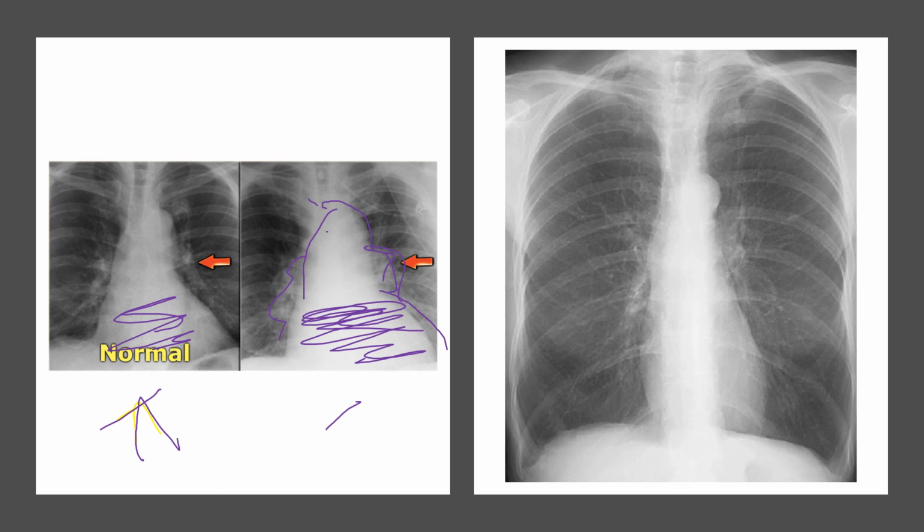And then over here is a case of hyperinflation. This would be emphysema. And one of the classic signs of an emphysema x-ray, and I will ask you this in disease class, so get ready, is going to be that tall, narrow, column-type heart. Because you see how tall and narrow that is? It's because the lungs are squishing it. They're being pushed in with all this hyperinflation. Right? They're being pushed in. So that's a big, big no-no.